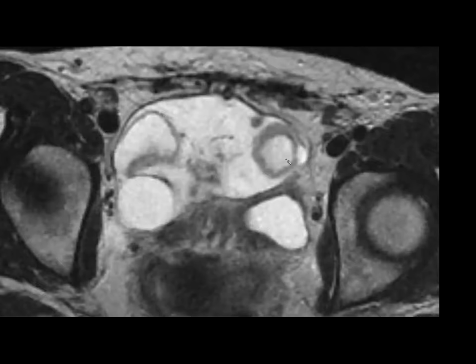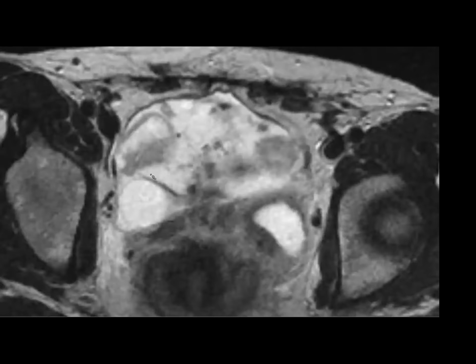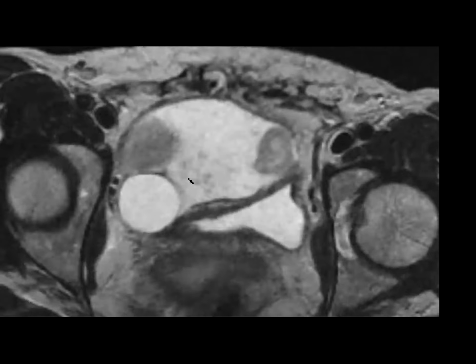So yeah, this is the perifollicular hemorrhage sign, which I think is a sign of non-viability of the ovary. Is that correct, Cookie? Yeah, but although the entire, if that's the whole ovary, then it's got T2 hyperintensity, which is what you see with viable. So I don't know if that's the nidus of the corpus luteum as the source. What's the source of the torsion?